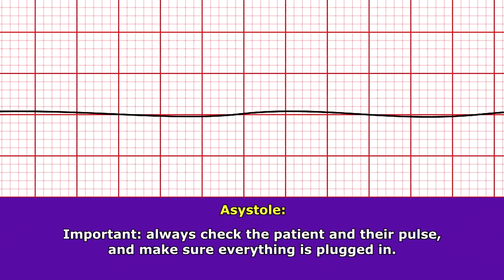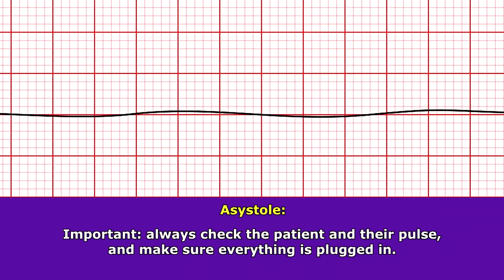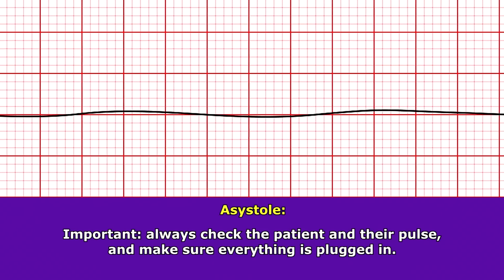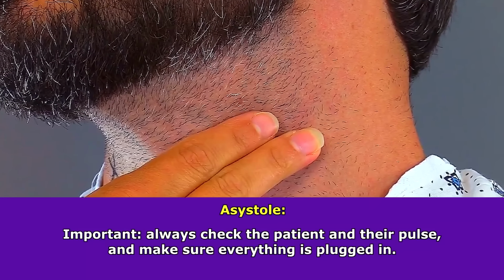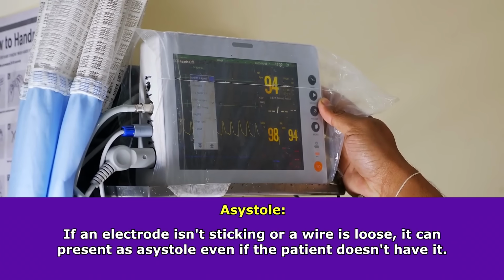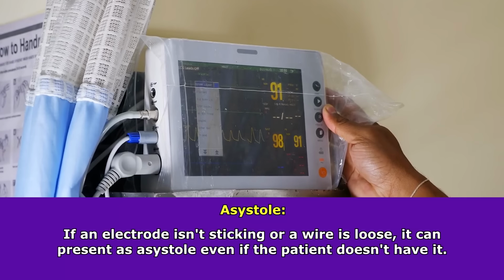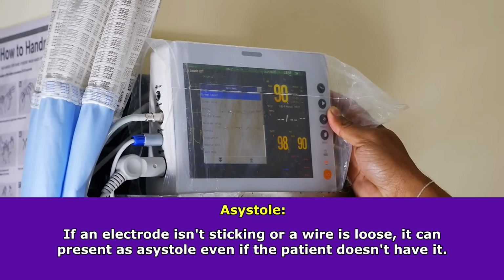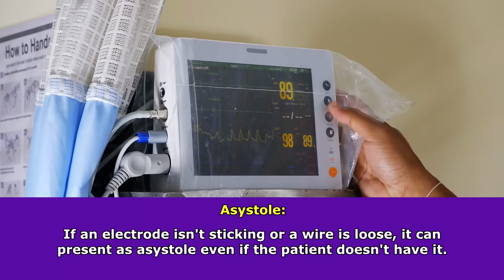Now the thing about this, whenever you see a flat line on an ECG, you want to immediately check your patient. Always check them, check their pulse, and make sure everything is plugged in and attached. Because if those telemetry wires become unplugged, or an electrode isn't sticking right, or you have a bad connection, it can present as asystole and you don't truly have it. So always check your patient.